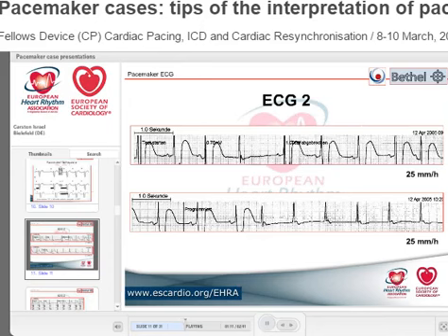What is here, we all know here should be a ventricular pace, right? It looks a little bit like this patient has an AV block, so he will not have a QRS himself. It would be nice of the pacemaker to help this patient in this situation, but the pacemaker doesn't do it. Why? Only one reason? Oversensing, yeah. If there is no ventricular spike, and there should be one, this is oversensing. Why on earth does this pacemaker always oversense when there's atrial pacing and not when there's atrial sensing?